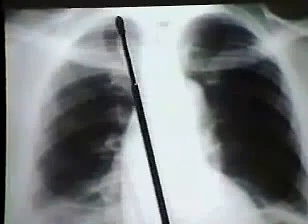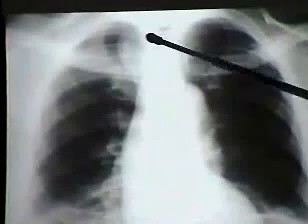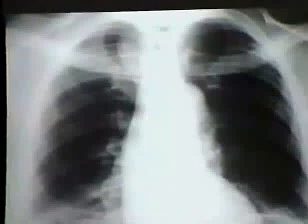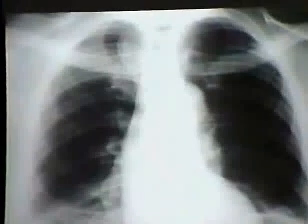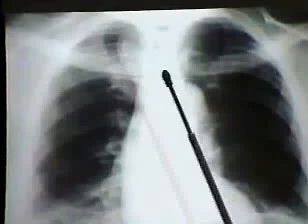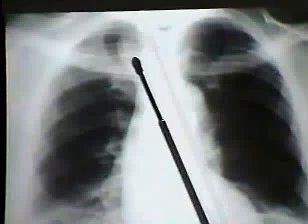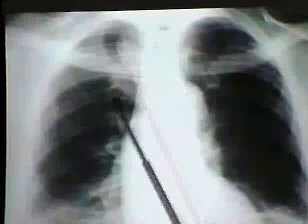This is the radiograph of the patient whose arteriogram you've just seen, and indeed it shows a very typical appearance of the tortuous brachiocephalic artery, making a convexity to the right of the mediastinum. If you look very closely here, you'll see a little bit of calcium in the wall of that artery. I want to draw your attention to the fact that the trachea is not displaced by this apparent mass shadow, and I think you've just seen why, because we're not looking at the contour of a mass with that kind of diameter. We're looking at a vessel which is only this wide, let us say, and it is coming at us, and that is displacing a pleura away from the mediastinum.